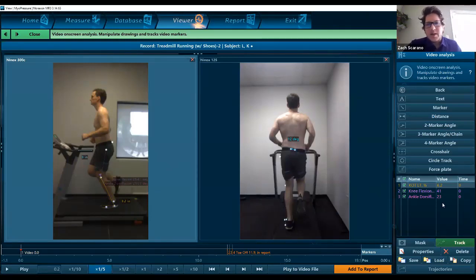So that's the next step in this journey, after we've made our drawings, and of course you can make as many as you'd like. Certainly I've taken a lot more time to set them up than they actually take if you're just going through the operations instead of explaining all the steps. And the other thing that's really neat is we have the ability to actually save these configurations.